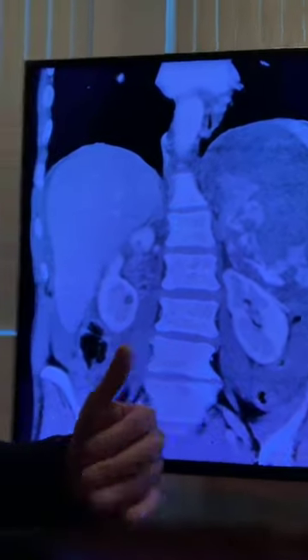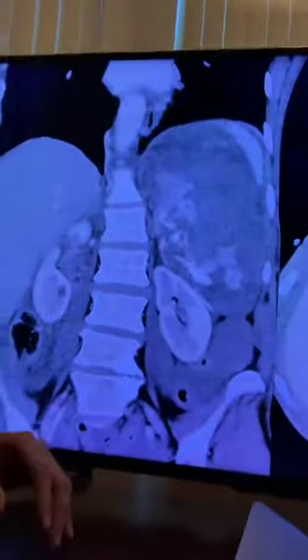There's different gradings of splenic lacerations. You can easily go look them up right now, Google it, and it's going to go through grade 5, basically. And this is a 5. This thing is completely burst open. So the spleen, just because you don't see it, you know it's all fragmented, you know it's a splenic rupture, but you need to take it one step further. You need to evaluate this scan even more than that.